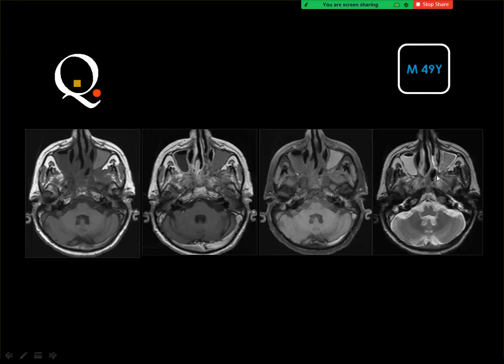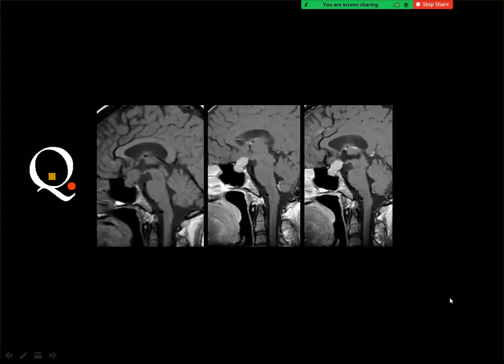with marginal enhancement. This is the enhancement of the fungus in the paranasal sinuses, enhancement of the mucosa surrounding the fungus. On the opposite side, you get simple sinusitis, which is of dark signal in the T1 and bright signal in the T2 with some air fluid level denoting an acute exacerbation or acute phase. But the right sinus is involved by fungal sinusitis.